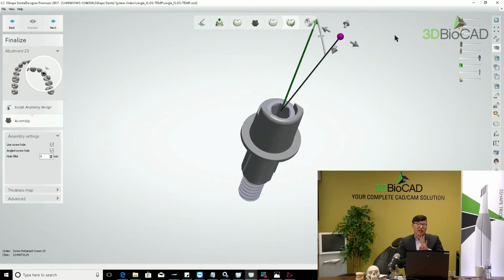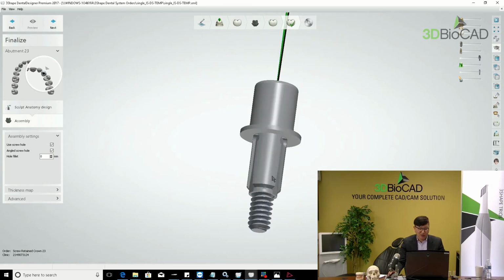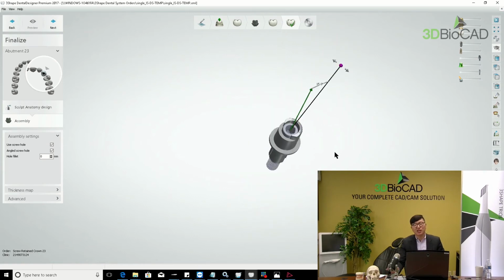Our surgical guide, and then the screw-retained crown, single case with hex titanium base. The doctor is not a robot, and cannot make the drilling and positioning of the implants exactly the same as our screw-retained crown, especially the rotation. Depth may be okay, but the rotation, we cannot make exactly the same as the doctor's drilling and surgery, and then our screw-retained crown cannot be in exactly the same position in the patient's mouth.